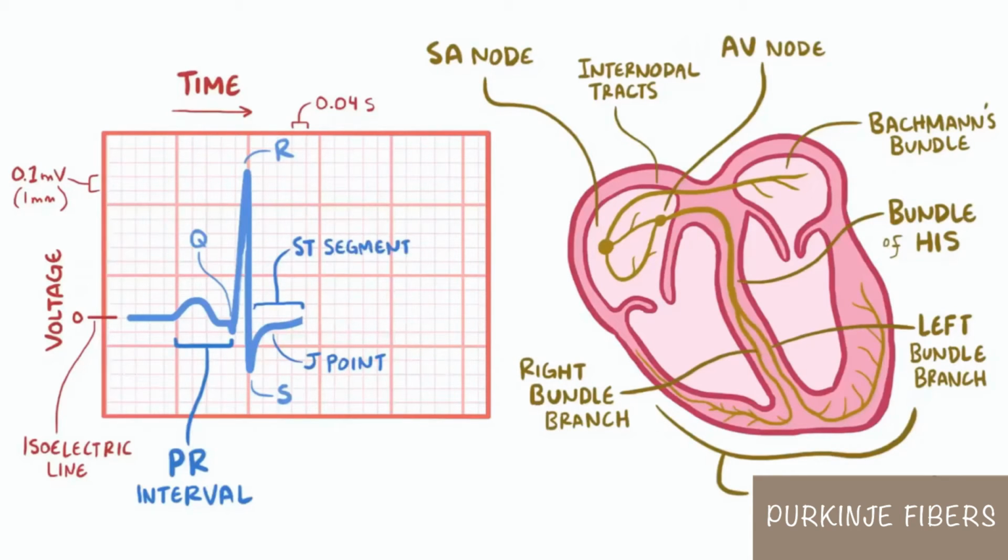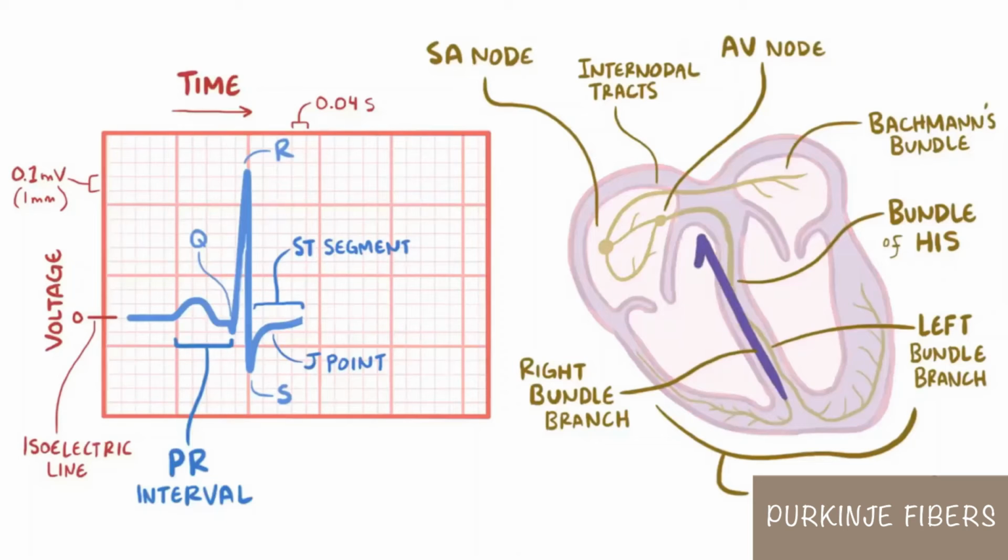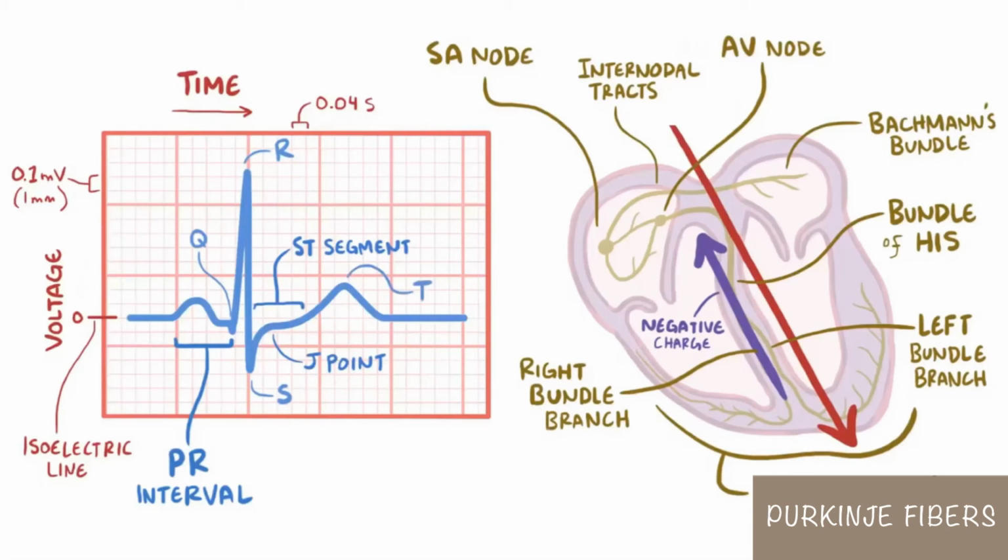After that, the ventricles have to repolarize, or become negative again, to reset in preparation for another wave of depolarization. Now, repolarization moves in an overall direction upward, opposite the direction of lead 2. So you might think that it should be a negative deflection, right? But really it's still a positive deflection, since this time it's a wave of negative charge. So essentially now when it's moving opposite to lead 2, it's a positive deflection on the ECG. And this final wave is called the T wave.